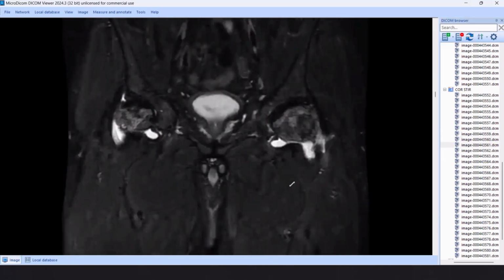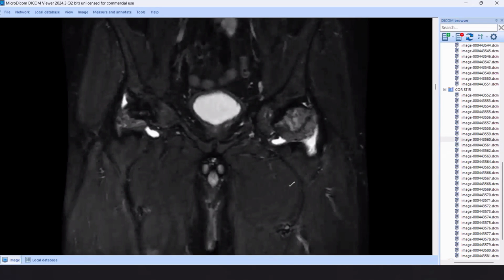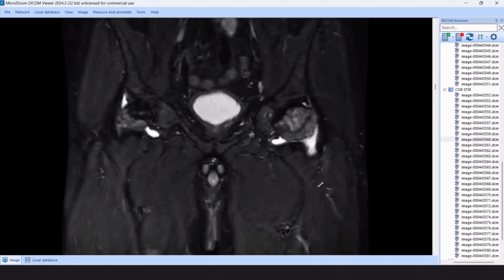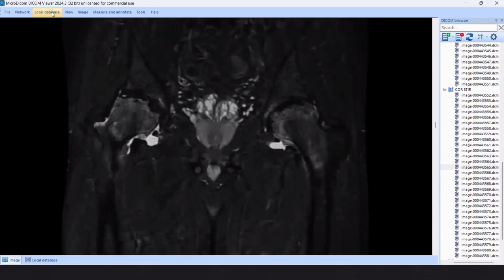In the STIR, as you said, we have a necrotic area at this area, and we have a marrow edema pattern, and we have also here. This is a very good sign. Do you know the name of the sign? Here we have the double line sign. Agree. Double line sign, outer dark area of sclerosis, and inner bright area of granulation tissue. This one is a trial of the bone to revascularization. So we have double line sign, pathognomonic for avascular necrosis of the femoral head. Also, we have bilateral moderate joint effusion. Okay, that's good. Thank you so much.